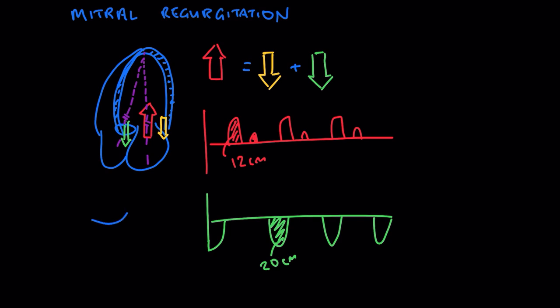So from our parasternal long axis, RV up there, we can get the dimensions of our LVOT, which will say that that diameter, if that's 2, then the radius will be 1. And then actually from the apical four-chamber itself, we can get the dimensions right here.